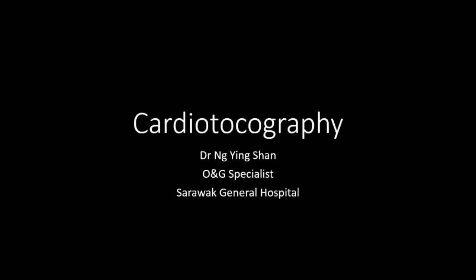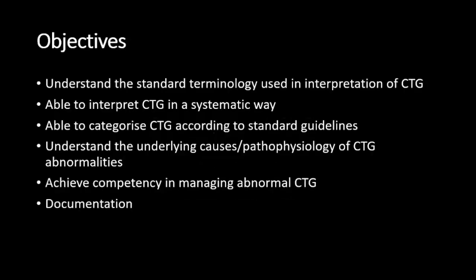Hi everyone, I'm going to talk to you about cardiotocography, which is a CTG. The objective of this tutorial is to guide you through and let you know the standard terminology that we use to interpret the CTG, guide you through a systematic way, and you need to classify it and categorize it accordingly, and the underlying causes and the pathophysiology of CTG abnormalities.